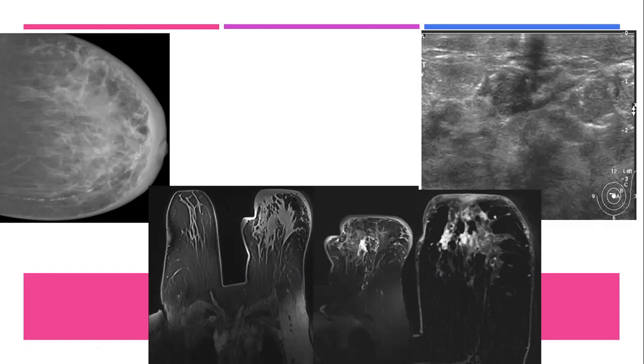No, this is the same breast, these two views, at different levels. This is the post-contrast and this is the subtraction image. If you look at the skin, there is an area of enhancement within the skin itself.